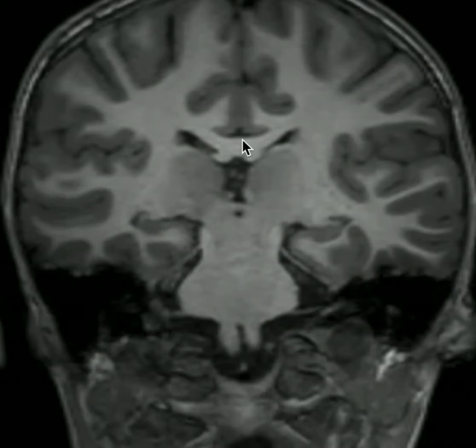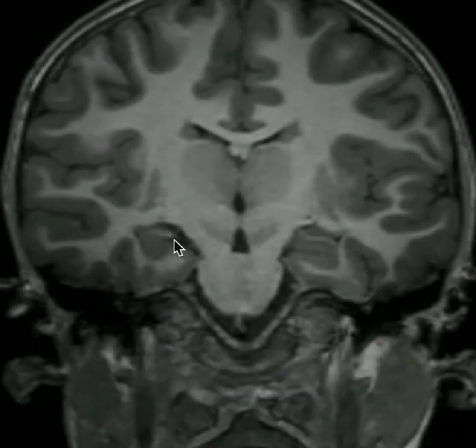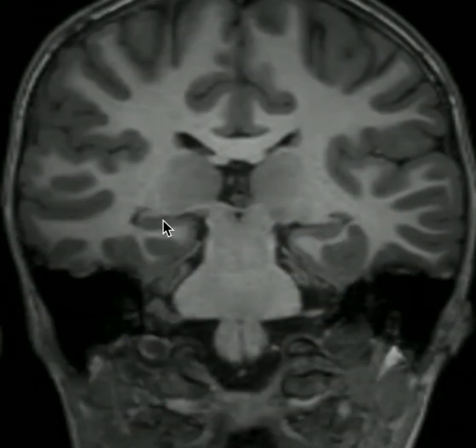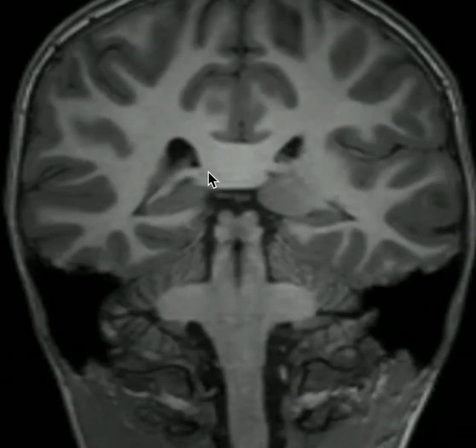But let's go back anteriorly now and discuss the fimbria as they merge into the fornices. So scrolling anteriorly once again, here is our fimbria here on the left and over here on the right. So let's watch these structures as I go posteriorly. Here it is, and it's going to come up right about here to form the right crus of the fornix. This will go over toward midline to meet up with the left crus of the fornix. This will arc back posteriorly before going anteriorly.